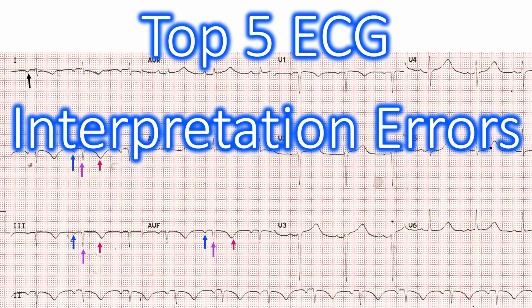Even for most seasoned clinicians, ECG interpretation is a blend of pattern recognition and rigorous systematic analysis. Errors usually occur when we rely too heavily on the former and skip the latter. Here are 5 of the most common and clinically significant pitfalls in ECG interpretation.